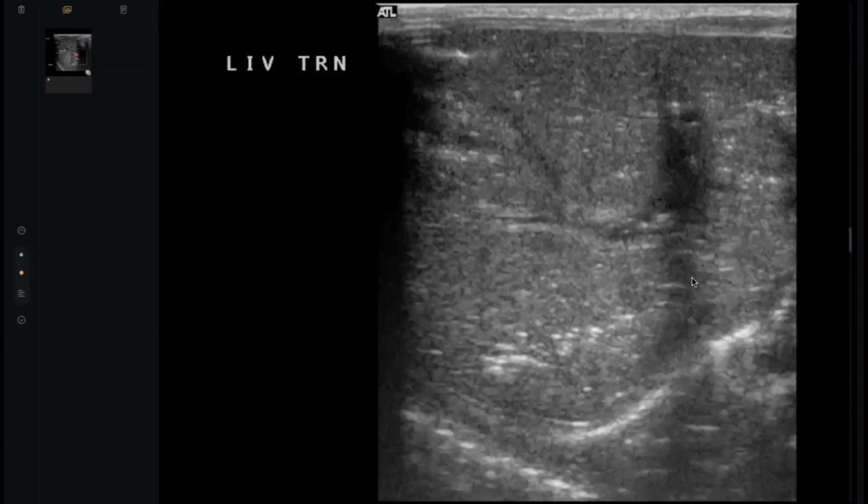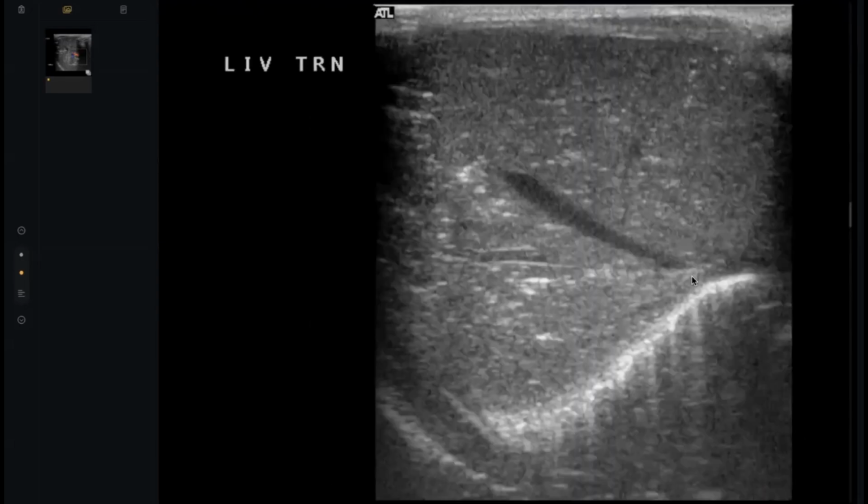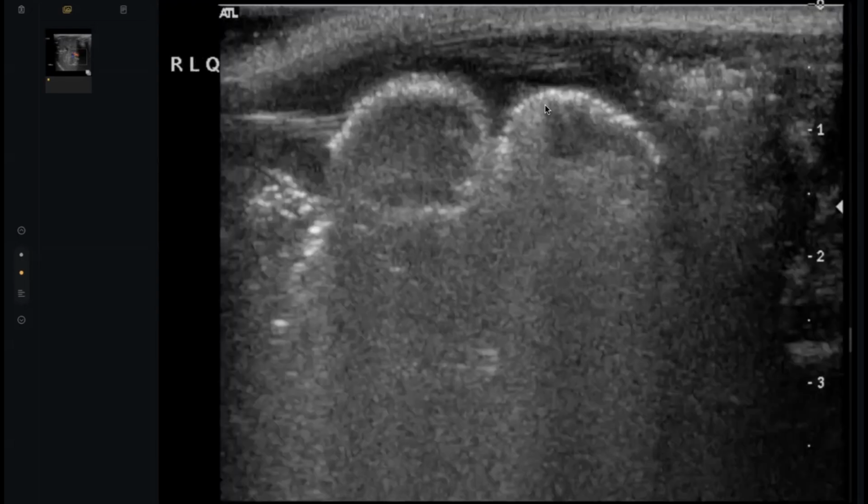I have multiple dilated bowel loops, and there is mild intraperitoneal free fluid, and there is echogenic wall in the non-dependent area of the bowel loops. Excellent. These lines look like pneumatosis intestinalis.